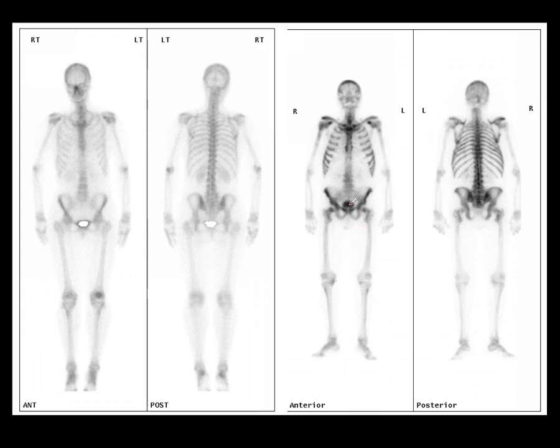So we've got some bladder activity. Kidneys, I can't really see much activity here, and don't forget you should obviously look for the kidneys on the posterior view because they are posterior structures and so will be seen best on that. But you can just see this predominance of the activity in the pelvis, ribs, proximal humeri here, and the spine, compared with the more even distribution that you see in the normal case.